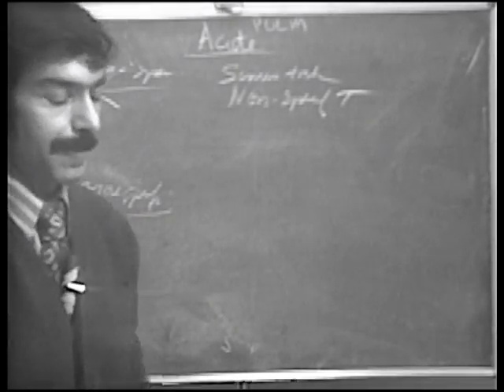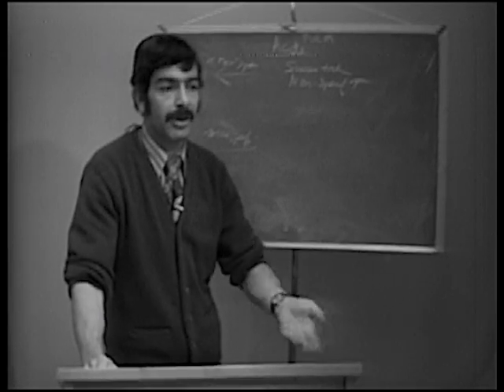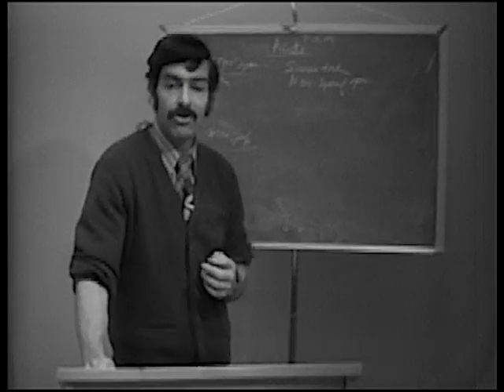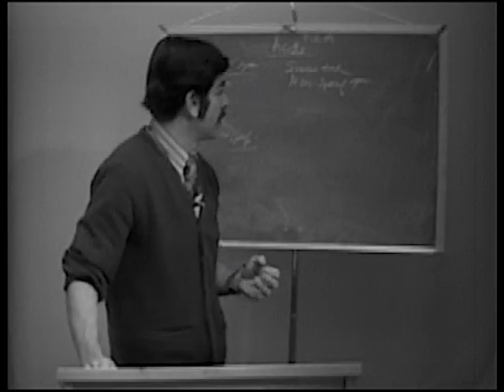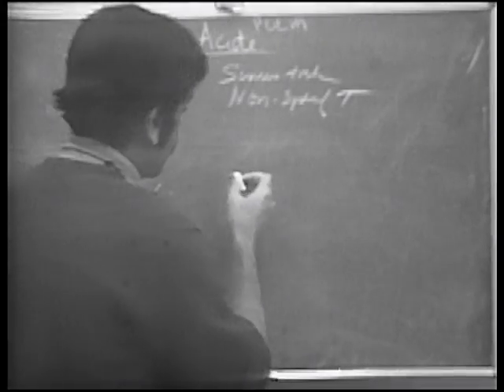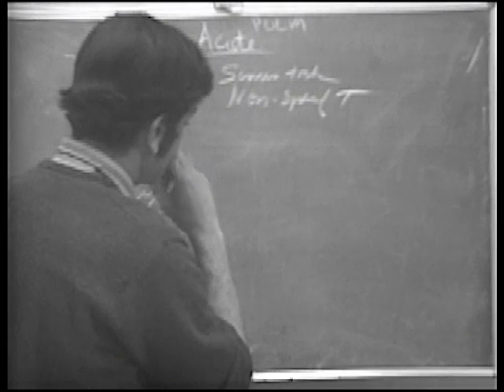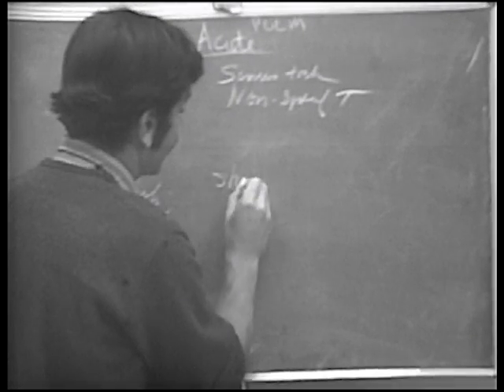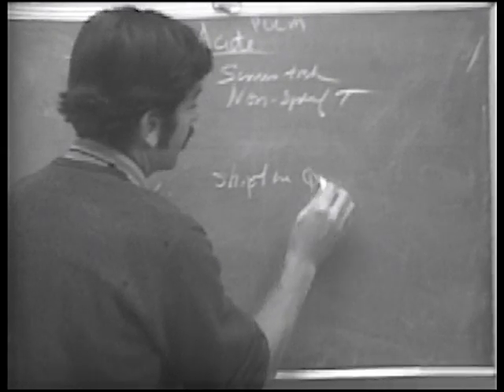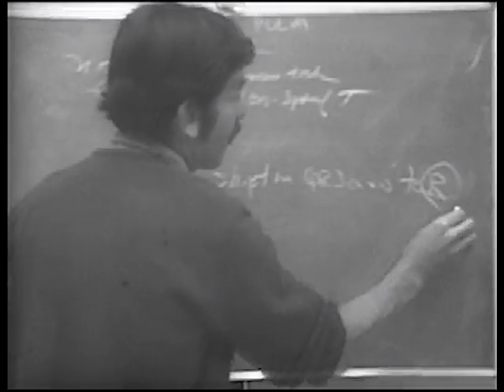And what are these? Everyone has heard of some of these, and they expect to find them on every patient that has, for instance, an acute pulmonary embolism. But as I point out, these are not that commonly seen. Well, what are some of them? One is, someone mentioned, you might see a shift in the QRS axis to the right. So a rightward shift in the QRS axis.